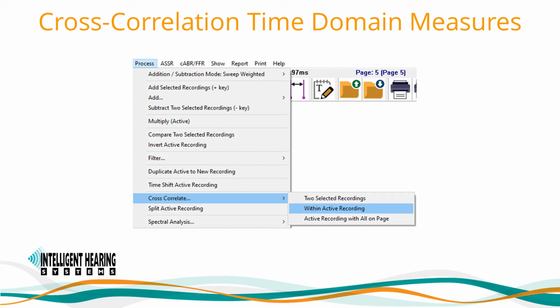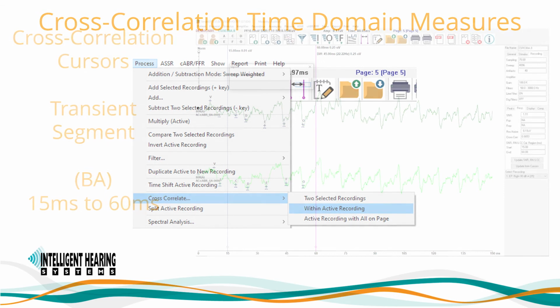text file will be generated with the information. You can save the text file for offline analysis or copy and paste the information into the text editor tool to add the information to your report.